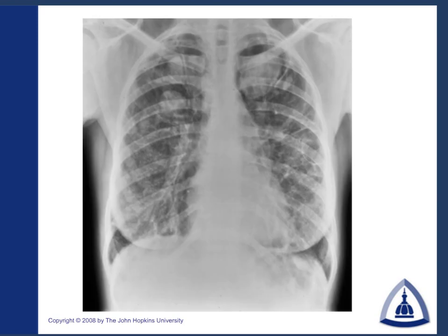This was a question that was on both my internal medicine boards and my pulmonary boards. This is a young patient with sarcoidosis, okay, who has a few weeks of hemoptysis. And when we look at the X-ray here, we see 1, 2, 3 nodules. This one might be a mass in the left upper lobe.